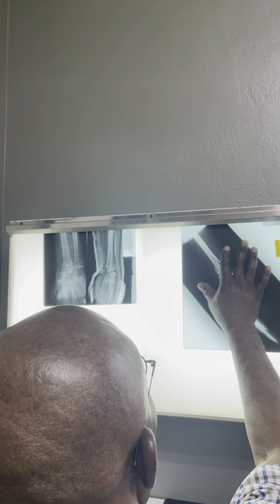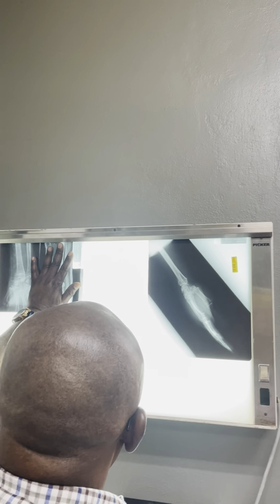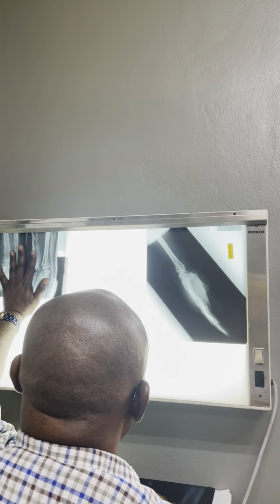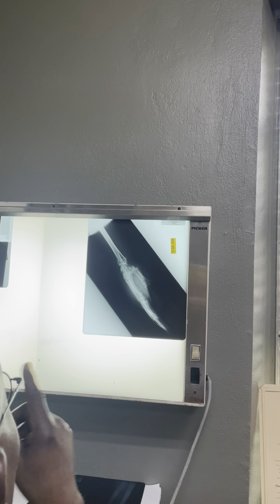Now, the example will start with you looking at the X-ray. You don't see any cast there, right? No. So that's the X-ray you're going to get first. Once you get that okay and you're doing well, then you might go to the other one. So let's look at this one first. If you're given this X-ray, let me hear what you want to say. Don't say it yet. Okay, Anthony, what do you see?